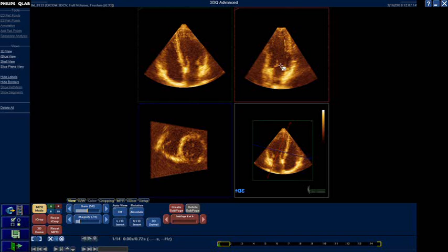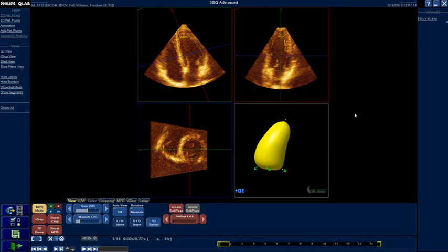This is the reverse of what we say if we are just doing a 2-chamber view from the transthoracic approach. Usually the anterior wall will be here and the inferior wall will be here, but this is right-left inverted inside this software. And then 1 point only, AP, which is the apex. I'm free to put it here or there. It is only 1 point, so I'll just put it like that. The software now gives me the end-diastolic volume, which is 95.4 ml.